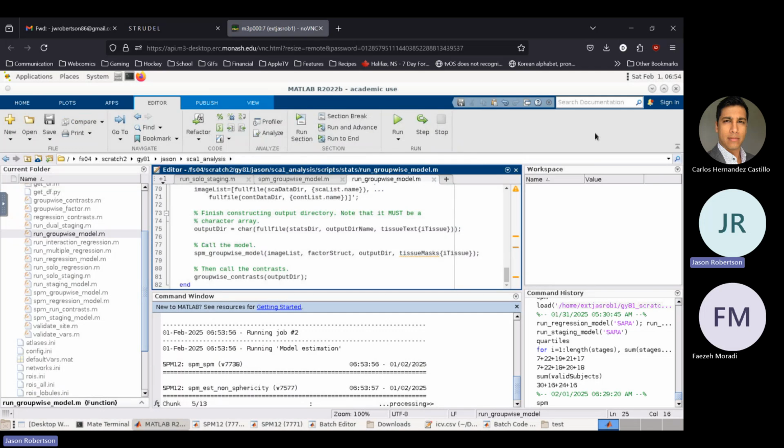13, there we go. But you didn't need to run it because you already have one, right? Yes. So, where do you put your contrast matrix? That's next. The reason why I'm doing this sort of in real time is to show how it works in real time. Okay.